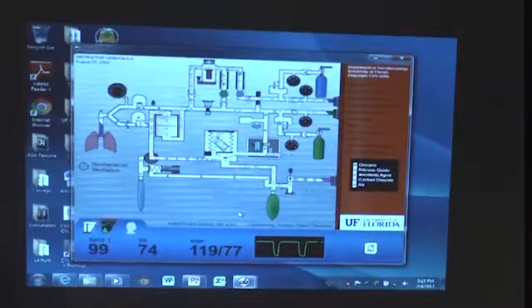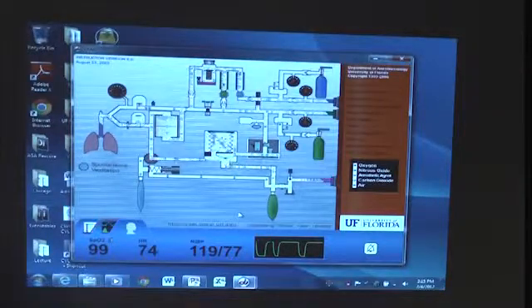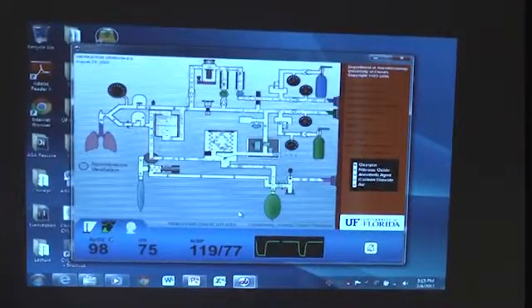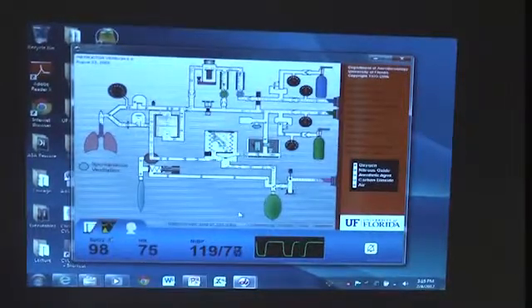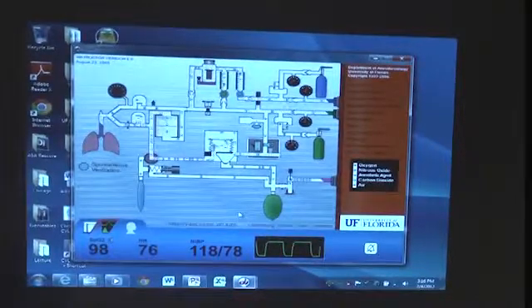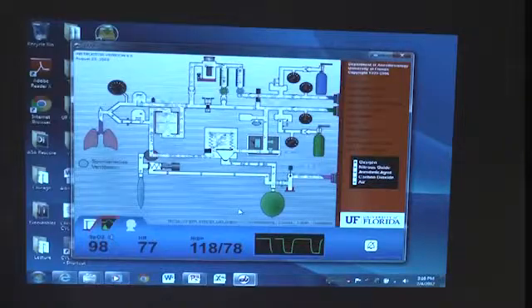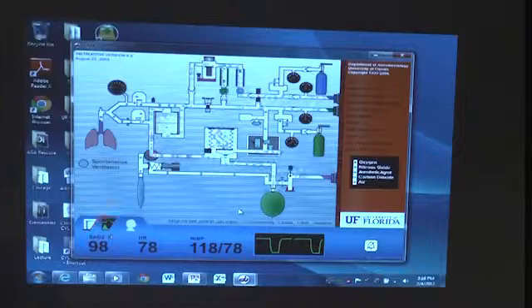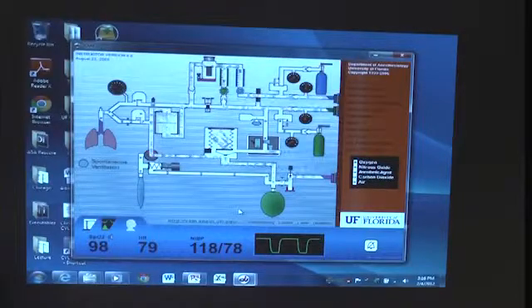Now, does the fail-safe work as the name implies? Does it work when the gas in the oxygen pipeline is not oxygen? No. So both of those safety features, which are designed to prevent hypoxic gas delivery, fail when the gas in the oxygen pipeline is not oxygen. So these are the 3 points. The hypoxic guard, or the ORC, or the proportioning controller, does not protect against the wrong gas in the oxygen pipeline. The fail-safe doesn't protect or prevent.